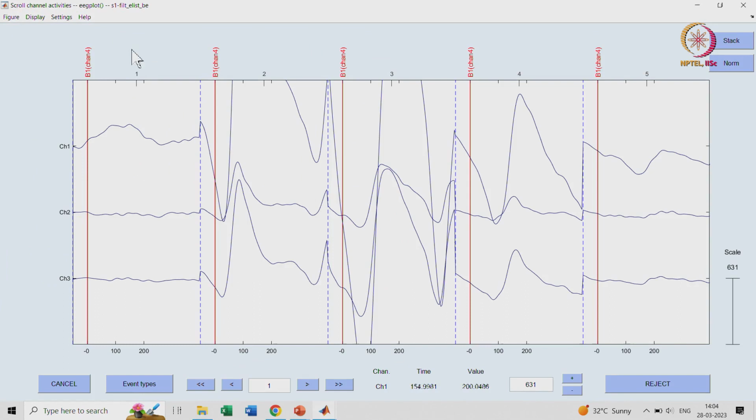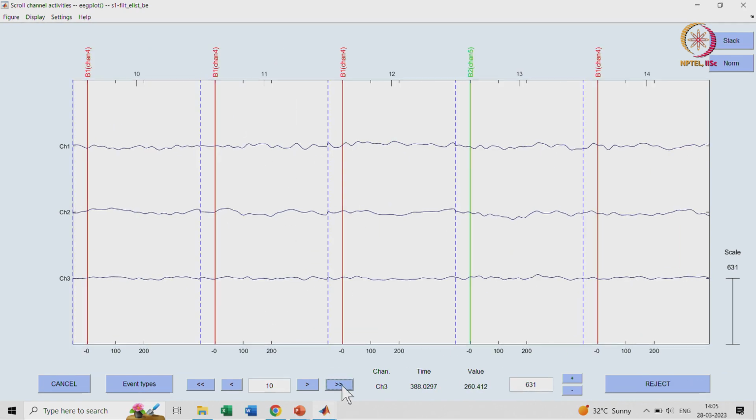At every point, you can see the earlier data has gone, and this dashed line has come which corresponds to minus 50. And then further it has stayed till 400. The other in-between data has gone. Okay, it has only saved the data which is in the range, and it is the same for all channels.